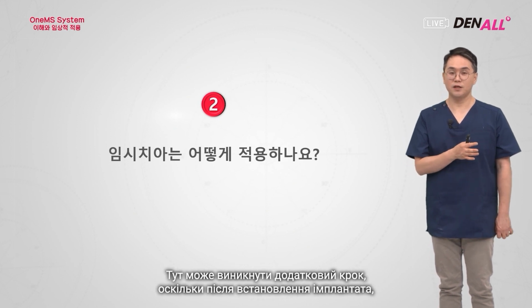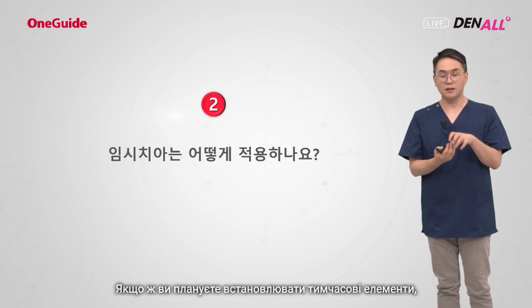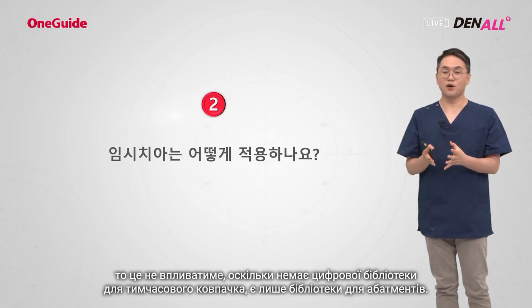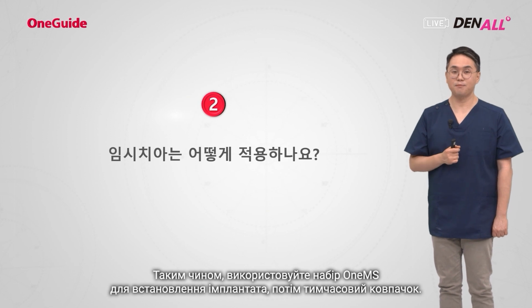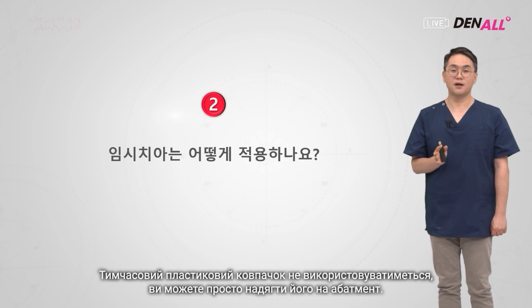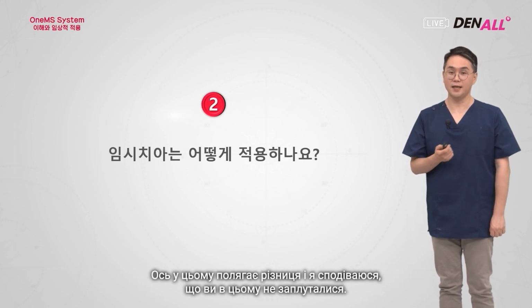It might be a new step, because after placement, if you put a temporary cap and, on top of that, a prefabricated provisional, it doesn't fit, because there is no temporary cap library, only a library for the abutment. So using the one MS system, placing a one MS implant, then the provisional, the temporary plastic cap does not have to be used. You can just cement to the abutment. That is the difference. I hope you will not get confused about this.